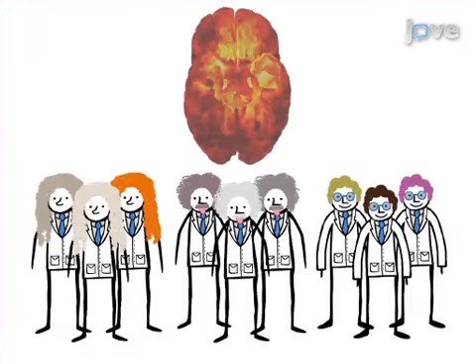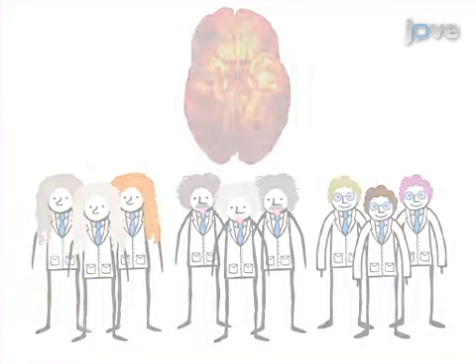The study population for this protocol should include 3 groups: right temporal lobe epilepsy patients, left temporal lobe epilepsy patients, as well as healthy controls. A total of about 35 subjects are recommended.